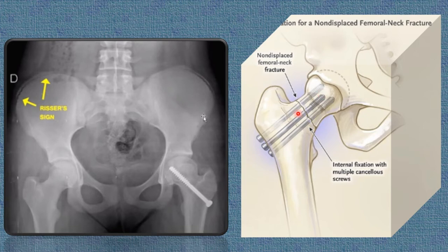So they are supporting the femur to remain fixed with the head of the femur, with internal fixation by multiple cancellous screws. And the fracture must not be throughout the neck, it must be just up to half of the neck. So that is why a single screw is being placed. This is the air which is present within the intestine, probably rectum.